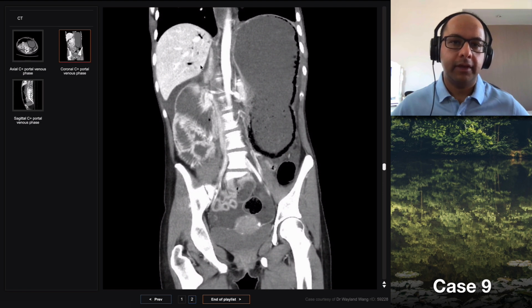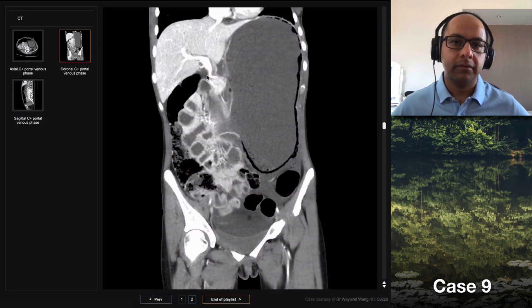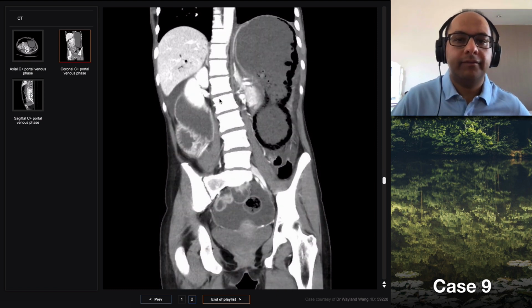That's right, yeah. I can also look at whether the biliary tree has got air within it. It doesn't look like it, and the presentation doesn't suggest a biliary problem. That's why I'm going to bet on portovenous gas. Okay. Great. Thank you.